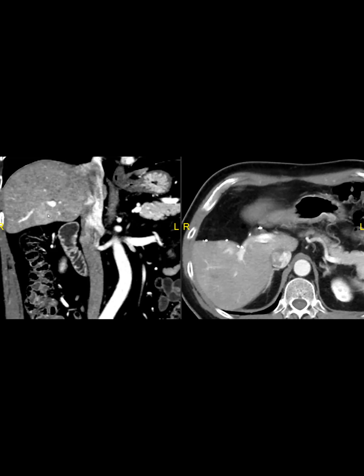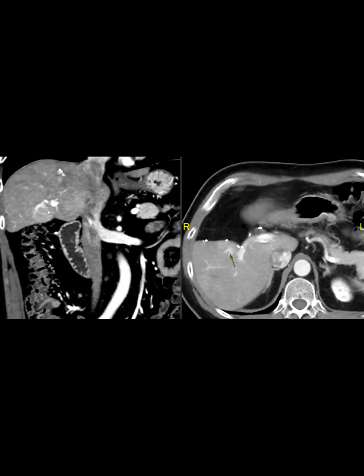Good to know. But anyway, there are things here that tell you that this is not just a perfusional thing, right? Because you have a lesion and there's a new perfusional change around it, however you want to call it, corona or whatever. It tells you that we're not looking at just the little rounded thing itself. This thing is not just a little perfusional thing. It's an actual lesion that's growing. And I kept coming back to it. So if something bothers you, come back to it. Okay.